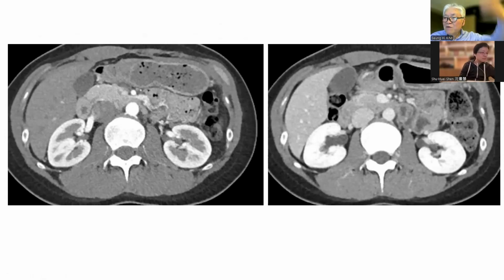So basically, 4 patterns of flow movement, and the additional movement of mixing of the contrast opacified and non-opacified blood. And then if we find the Nutcracker phenomenon in the CT scan, we may recommend it to the clinician in our CT report that way.